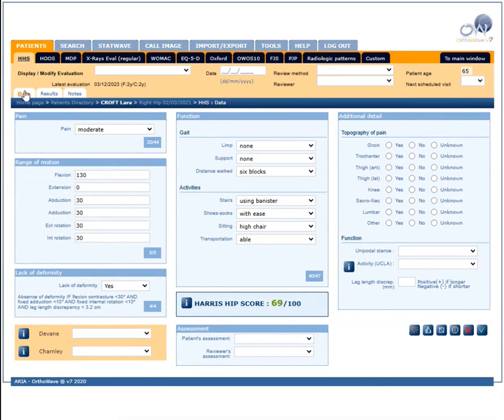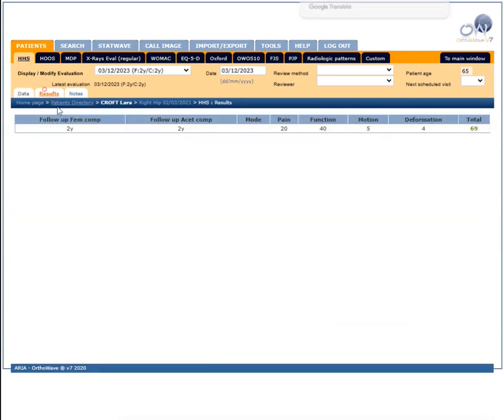The calculations are displayed as they are entered using the drop-down lists or via the time-saving shortcuts for new data entries, to obtain a result displayed at the choice of the period considered, with a summary table and explanatory notes.